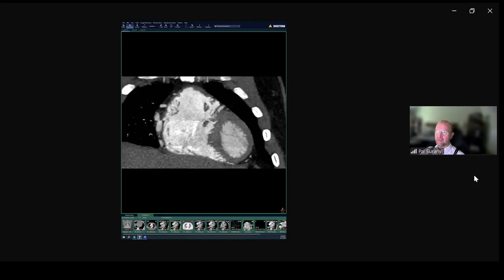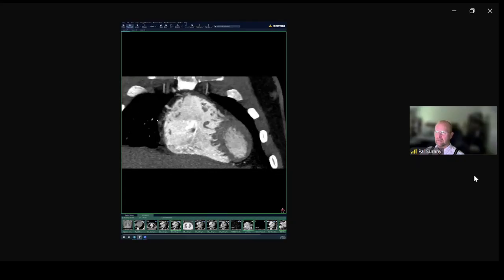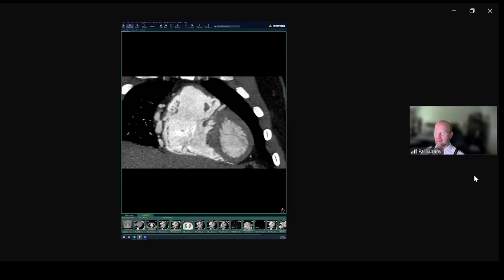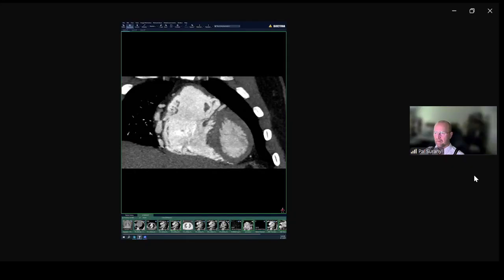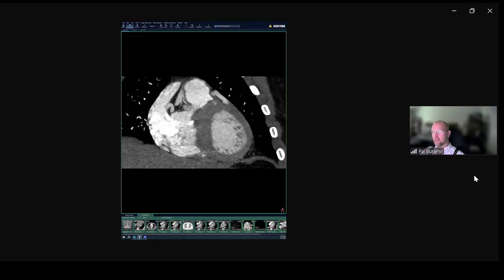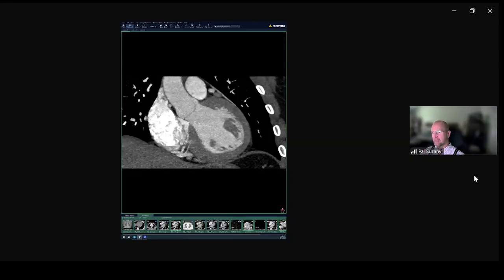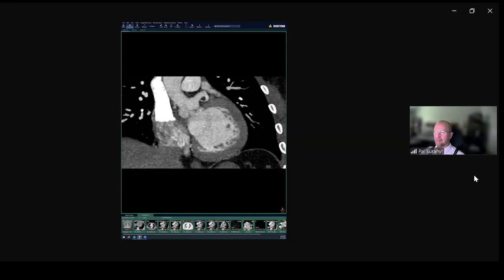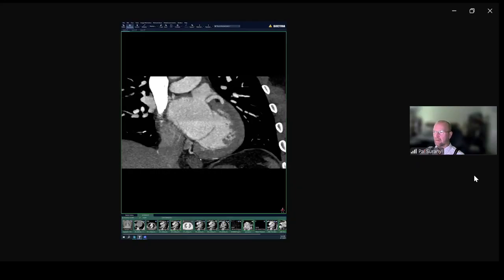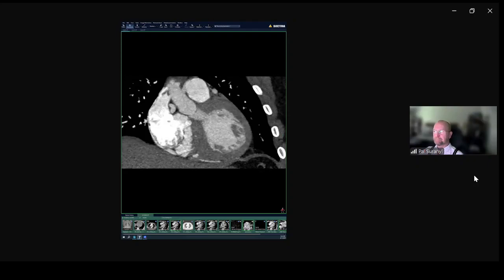There are some misregistrations here, of course. For the right coronary here in the AV groove.